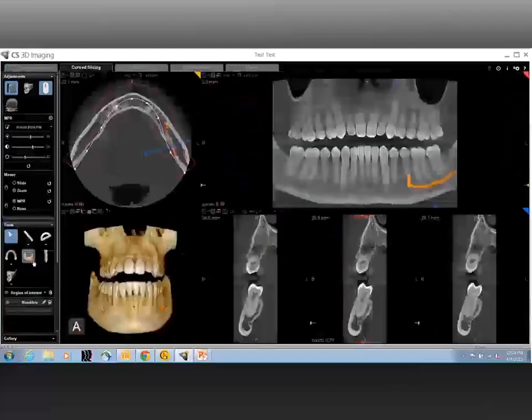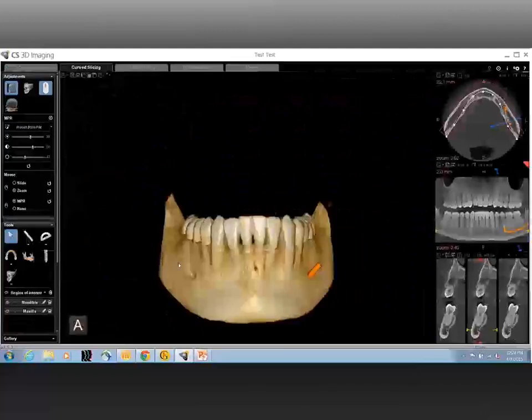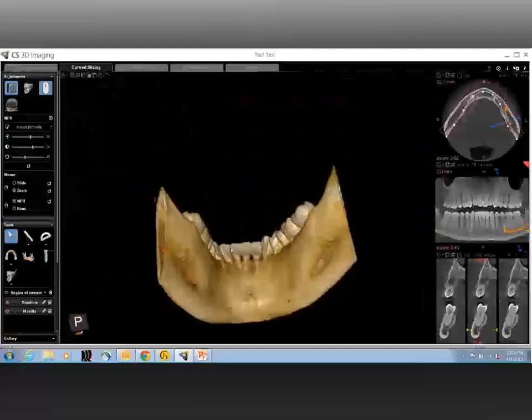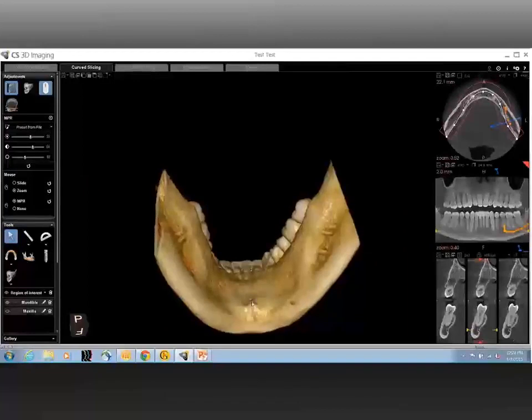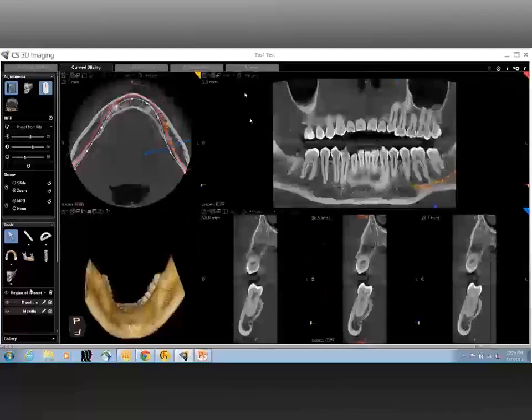Now, besides the mandibular foramen, we should also remember that we do have a lingual foramen that is ideally located around the genial tubercle, which is in the midline area between the two central incisors, as demonstrated. Right now, you can see it as a little hole. The lingual foramen opens into the sublingual space, so that is also a critical structure to be evaluated. So all in all, starting from cortical bone up to the lingual foramen are all critical structures that definitely, I would emphasize, have to be visualized and interpreted.